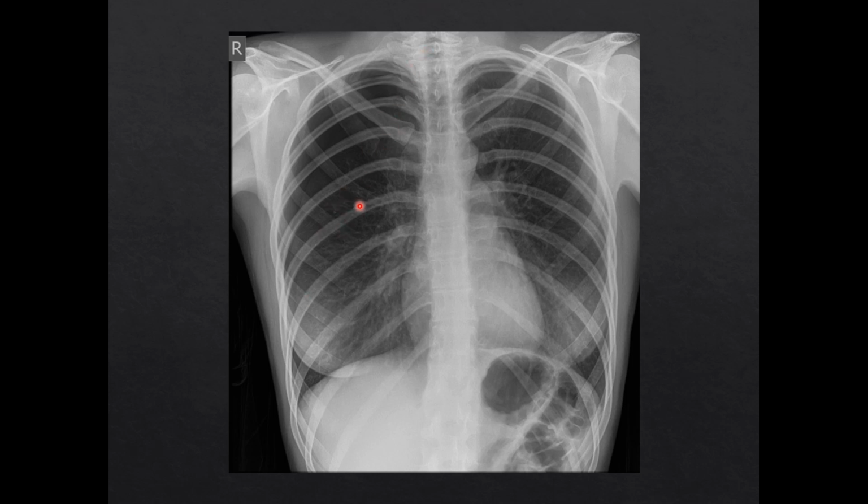On this side of the patient, the right side, we can see a difference. Usually you'll look left and right and left and right, and you go back and forth. Up here, it doesn't match the same color that we see up here. It's darker. Not only is it darker, but it seems to lack those lung markings. And if we really look closely, we can see this crisp line that we'll zoom into a little bit later to show more clearly. But all of these lung markings in the right lung don't cross that crisp line. And that's really what you're looking for with a pneumothorax.